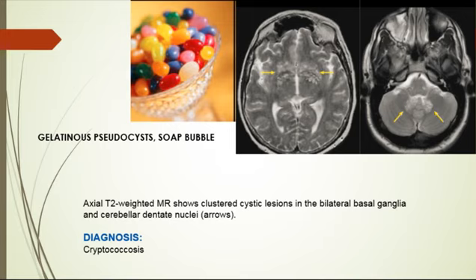Okay, the predominant areas can also be seen. You can see that is the basal ganglia, the thalami, midbrain, cerebellum, periventricular regions, which appear hyperintense on T2 and variable on T1, depending on the mucin content of the cyst. The degree of immunocompetency will determine the amount of edema and enhancement. Early treatment with IV antifungal is crucial to minimize the morbidity and the mortality.